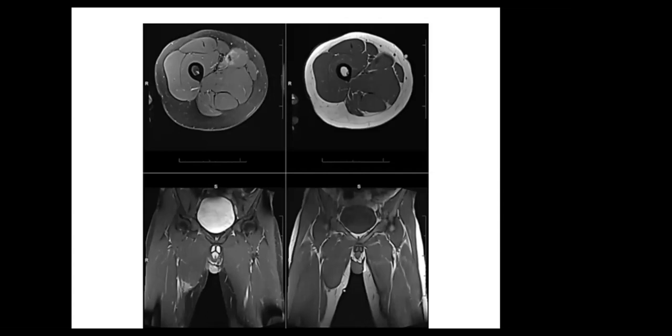It may be a muscle injury, no definite tear, just focal increased signal intensity. I can't see the exact location. It may be at the myotendinous junction on the coronal images, maybe a focal tear in the muscle.